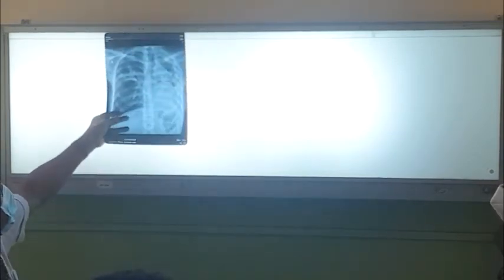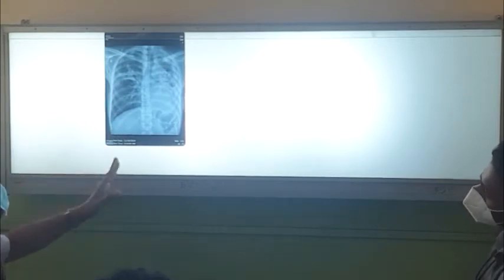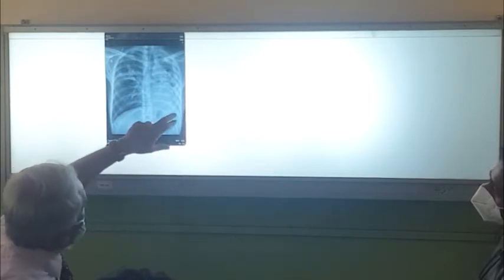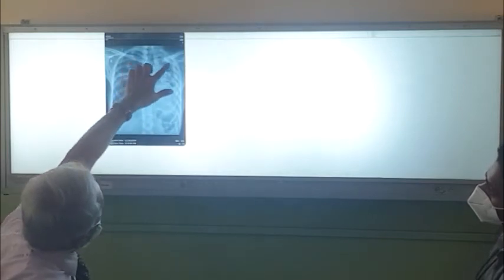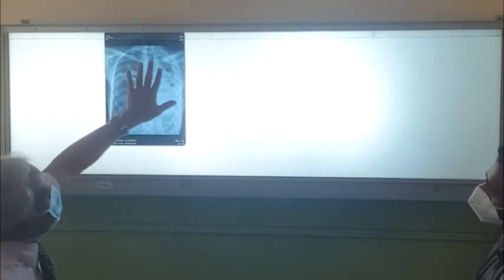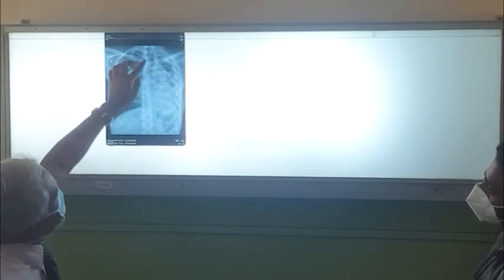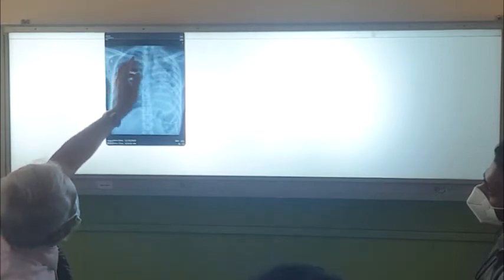Right. Again, a post-TB patient, but a lot of things you can see. So on the left side, now you can't see the cardiac shadow here, it is shifted there. You can't see the hemidiaphragm, you can see the descending aorta. So everything whitish with a dark area suggesting cavity. So it's a fibrosed left lung with a cavity, right? And the trachea is shifted because everything collapsed.